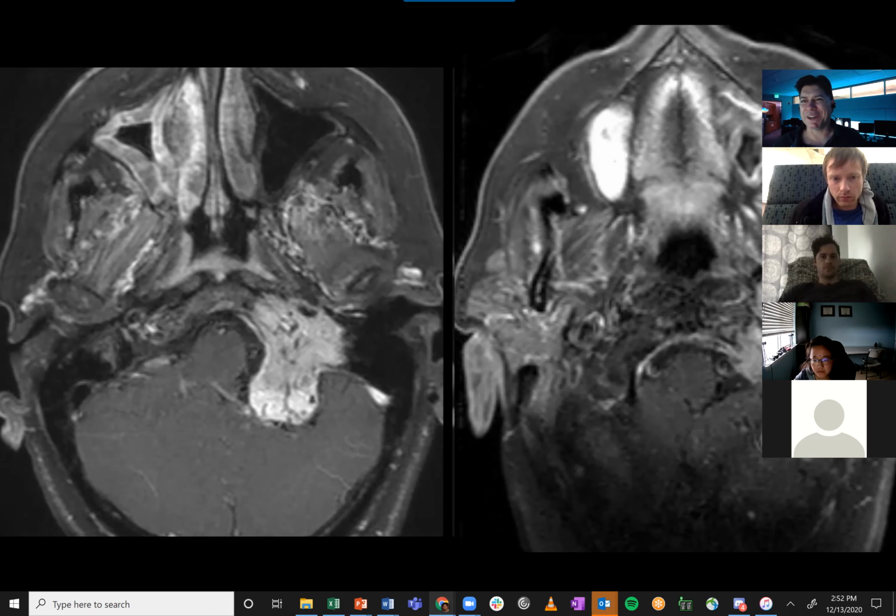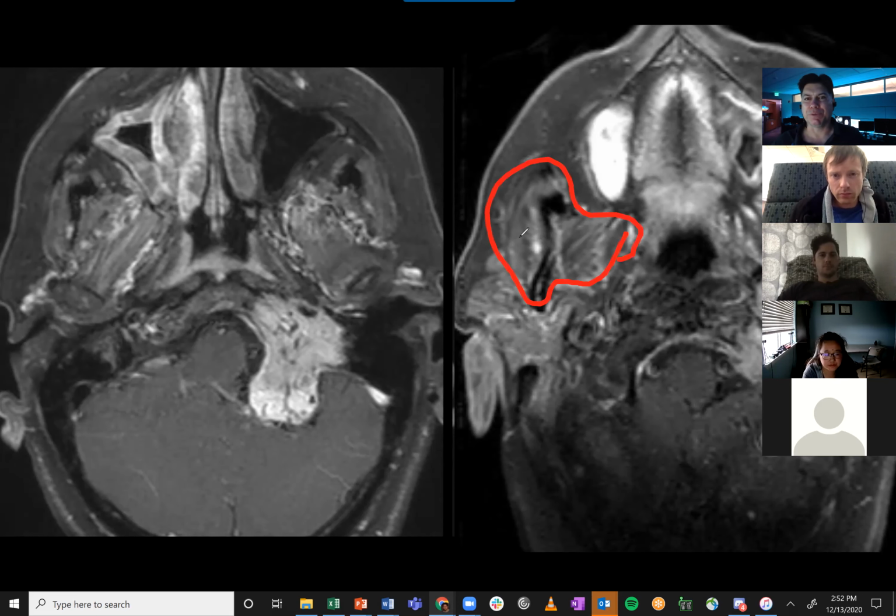It might be the carotid sheath or space. The masticator space is going to be around the muscles of mastication, around the mandible. So you have your masseter out lateral and your medial and lateral pterygoid medially. So this thing might technically be behind the masticator space.